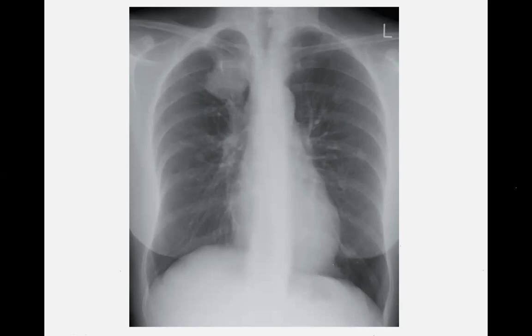عشان توصف هذه طريقة in medical terms، تقول حق الاكزامينر ان there is a round opacification in the right lung in the upper zone. ليش؟ لأنها بالرئة اللي على اليمين وفوق في upper zone. عشان توصف الوايت شادو تقول the opacification has well defined margins، أطرافها حادة, it is basically well defined and it's round.